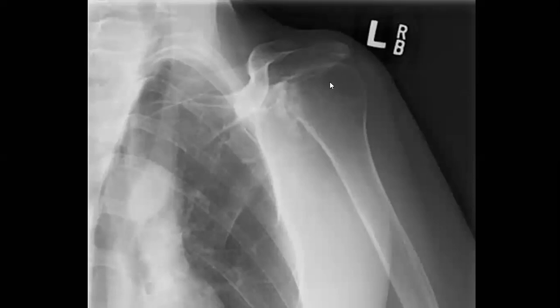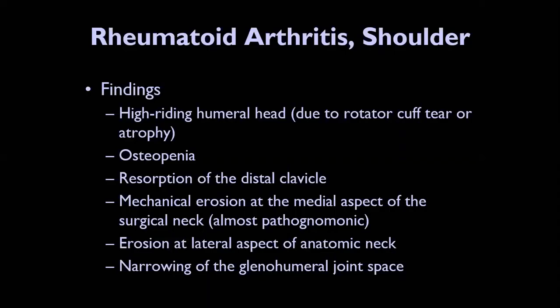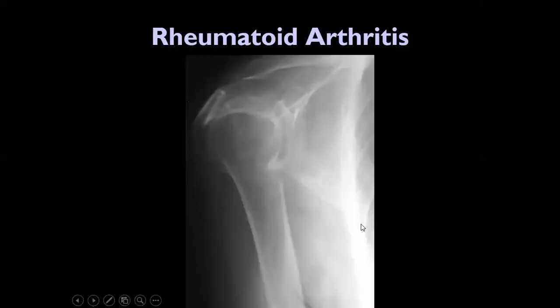So you are going to think about osteoarthritis, or again one of the inflammatory arthritides which have erosion. When you find this type of erosion, again you will go with inflammatory arthritis, right? And one of the big titles will be, again, rheumatoid arthritis.